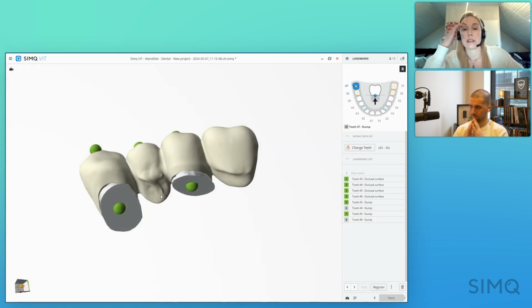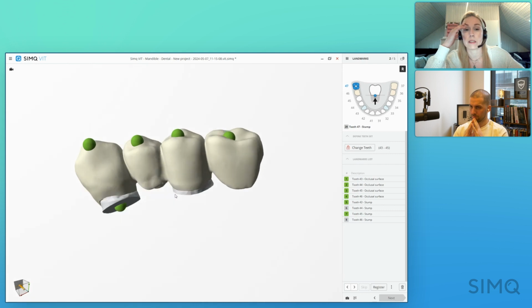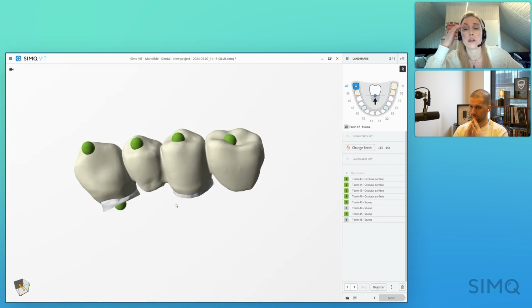And what's important is, like that previous maxillary subperiosteal implant, you saw that there was a portion of the maxilla that is missing. Sometimes with these surgeries, you're not going to have a place to set landmarks, but it's nice because with these workflows, if you need to skip an area, it doesn't affect the quality of the simulation, because sometimes they're just not there to register.